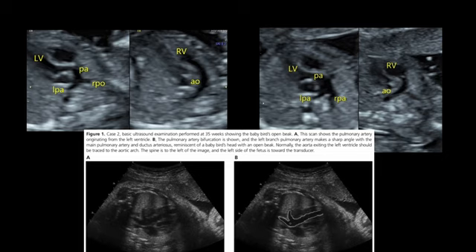If you see in the lower picture, it is drawn in the white line. This bird's beak sign is formed because of the sharp angle made by the left branch of the pulmonary artery with the main pulmonary artery and ductus arteriosus. So to repeat, the bird's beak sign is nothing but the sharp angle made by the left pulmonary artery with the main pulmonary artery. This gives the appearance of a bird's beak. Also, bifurcation alone does not confirm that it is the pulmonary artery; we have to trace where these branches reach, on which organ they supply, and the pulse wave Doppler can also help us in differentiating the pattern between the great vessels.